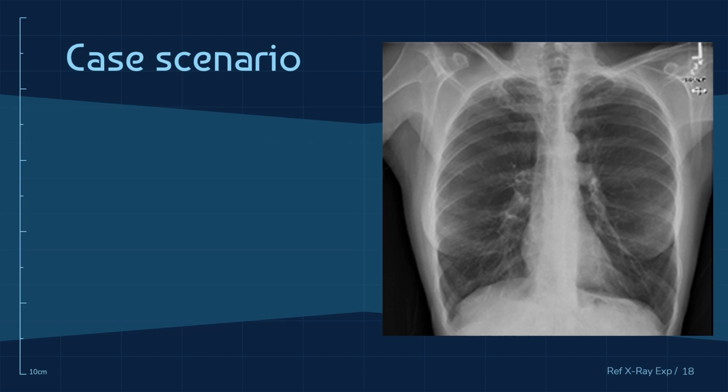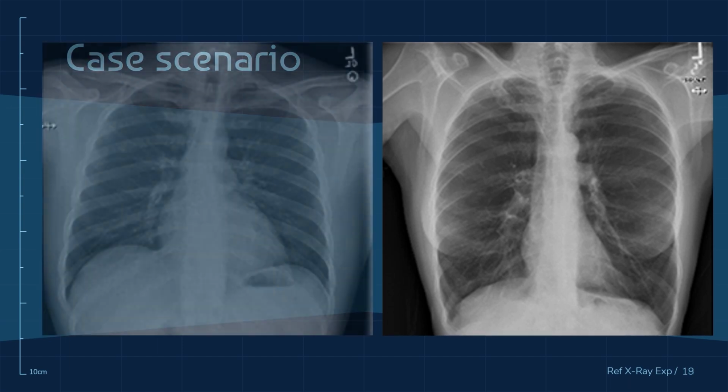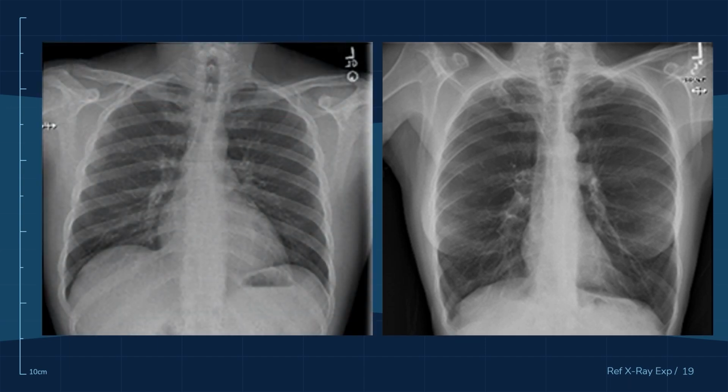So here I will attach a normal chest X-ray, just so we can compare between the different pathologies that we can see in this X-ray.